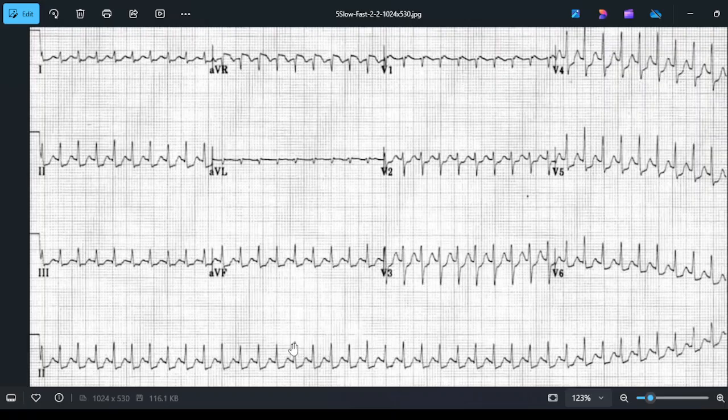Okay, so check any 2 or 3 consecutive ones. If they are the same, then the rhythm is a regular rhythm. This will be helpful when you go for atrial fibrillation, which will be an irregular rhythm, which I will show further on. Okay, so now in this case, this is supraventricular tachycardia, and you will have a typical history in OSCE cases.